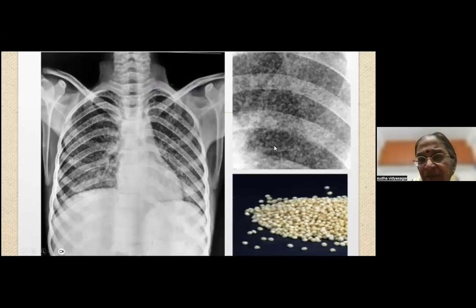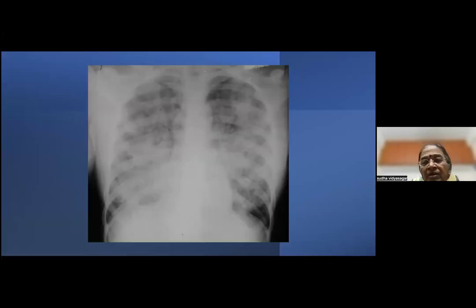Sandstorm appearance. Okay. And please don't think these are rib erosions. They're not rib erosions. Okay. They're just the miliary sitting on those ribs. Okay. You're seeing them. That's all. Okay. What is that? What is that now?